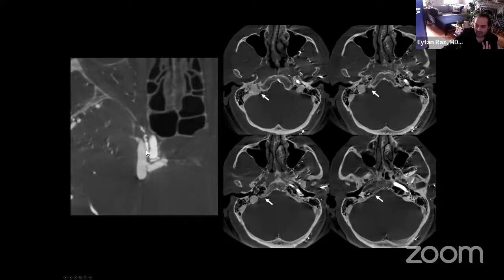When you look at these images separately and you start looking at the cross-sectional images that come out of it, you start understanding the compartments of the fistula. You can start to understand which compartment you really need to close this fistula. You can also understand better the approach you can have for it. For example, in this case, even though the flow went all to the right hemisphere, there was a very small, little inferior petrosal sinus. So we tried to go that route, to essentially catheterize a hypoplastic inferior petrosal sinus.